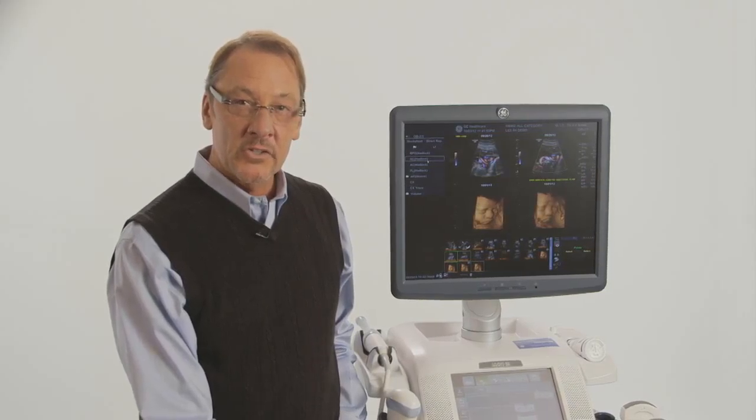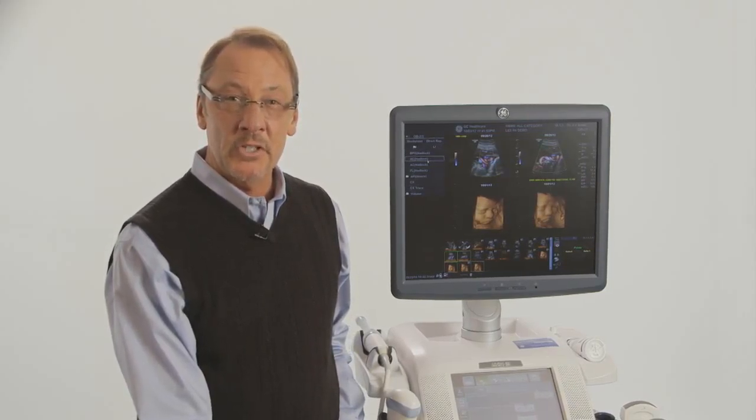Welcome to the Logic Series video tutorial volume imaging guide. This video will help provide an introduction to volume imaging and manipulation using an automated or 4D probe.